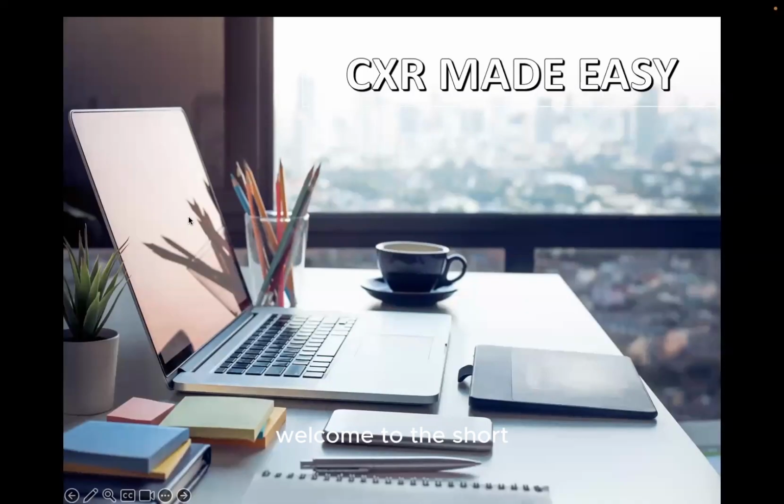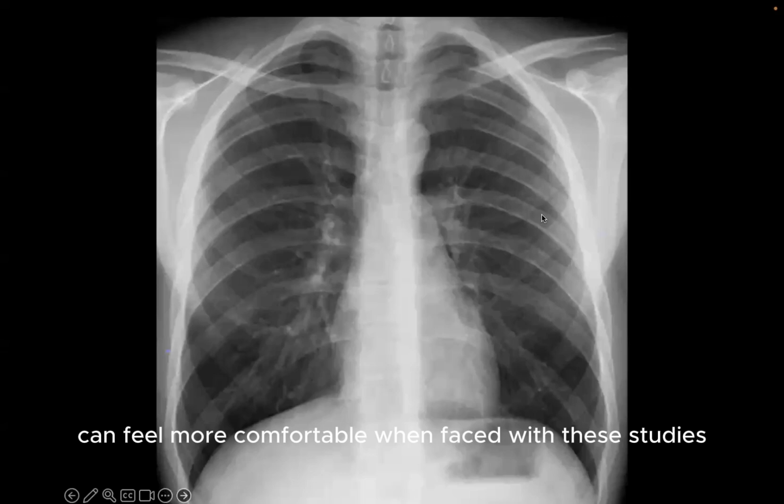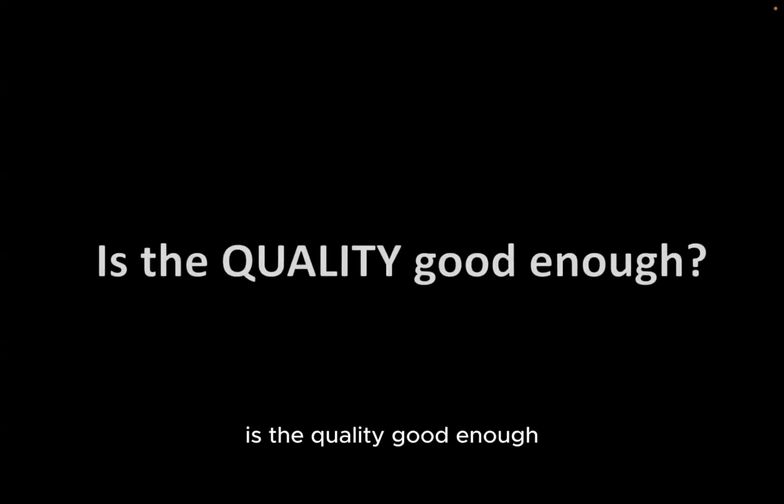Welcome to this short tutorial of a chest X-ray made easy. In this video, I will simplify the approach and interpretation of a chest X-ray so you can feel more comfortable when faced with these studies. Before we look at any chest X-ray, we need to ask ourselves first, is the quality good enough?